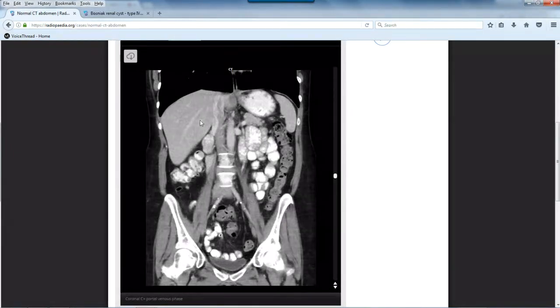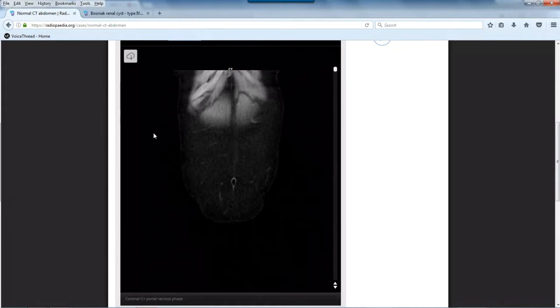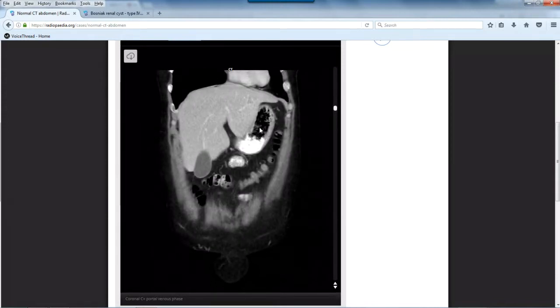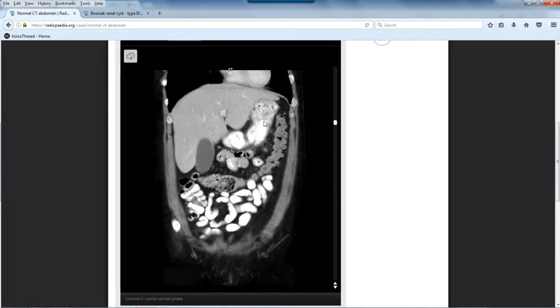The only difference is with CAT scan, we have different slices, whether we're posterior or anterior. So if we start all the way anterior and we scroll back, we're going to see our stomach. So let's try to get the best view of the stomach here. I guess it's probably right about here.